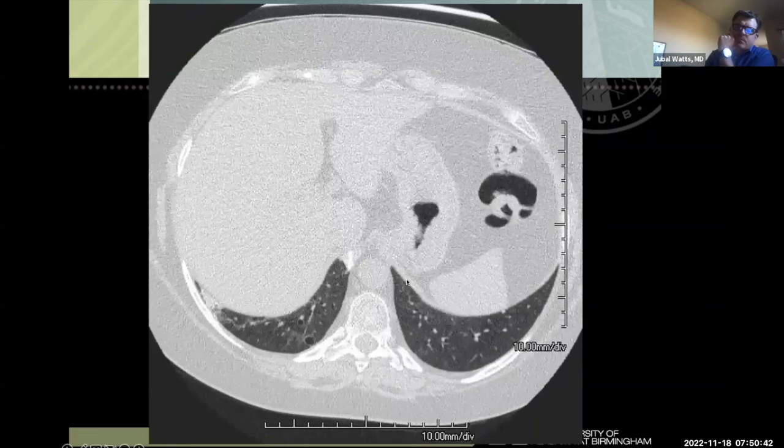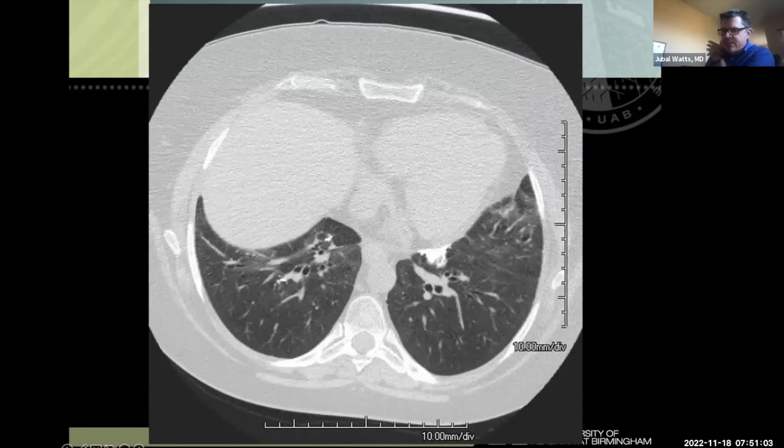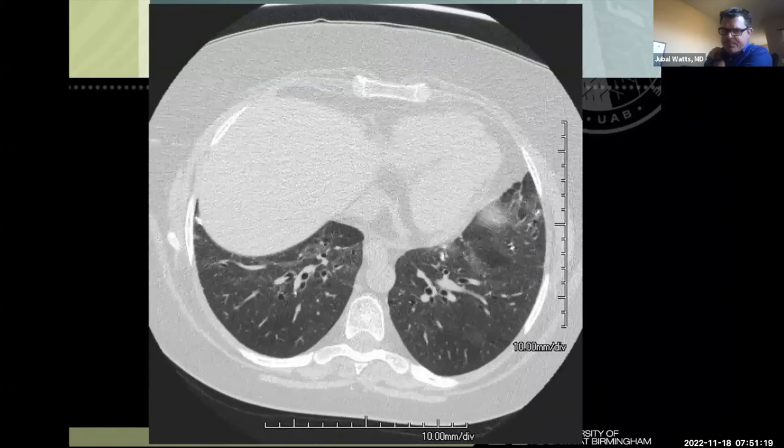And in addition to that, we have this kind of bizarre calcification. So here you can see some calcification kind of in the little sulcus there between the right lower lobe and the diaphragmatic crura, and several other areas of kind of this bizarre amorphous calcification. So we see a lot of calcium in the lung. We usually chalk it up to granulomatous disease, but granulomas don't do this. You can see it's kind of spread out along the mediastinal pleural surface. So this would not be your typical old histo or TB.